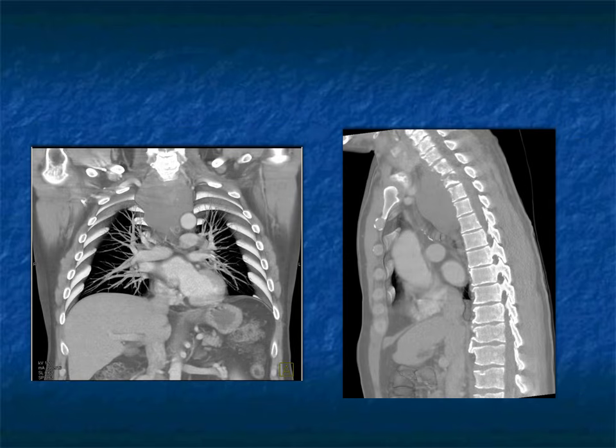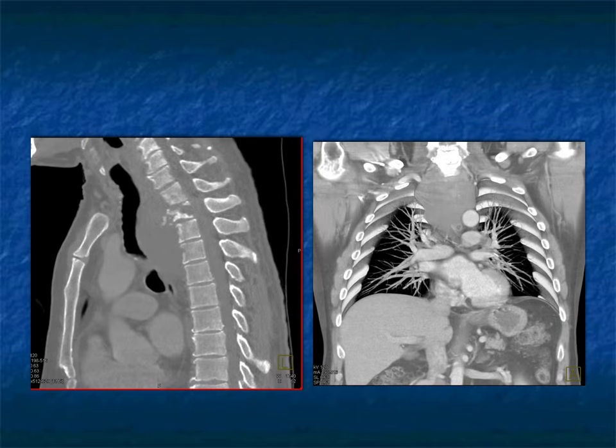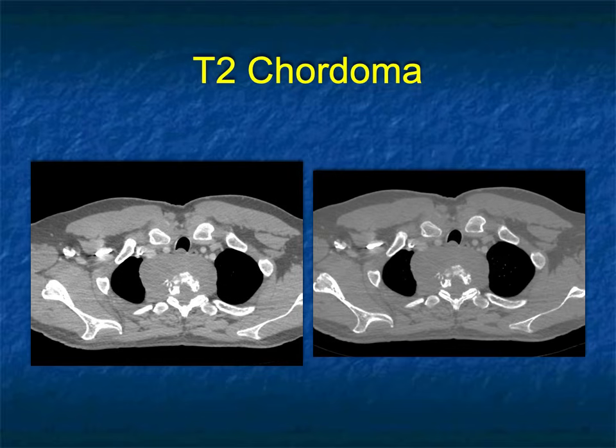So you can say primary bone tumor, lymphoma. What else? Not the best location, but chordoma involves the spine. Usually it's in the clivus or at the lower lumbar spine by the sacrum. But this is a large mass. It could be metastasis. It could be lymphoma. Those are all indeed possibilities. Bone destruction, you could think about infection like an osteomyelitis. This ended up being a chordoma. Just a really, really nice case of a chordoma.